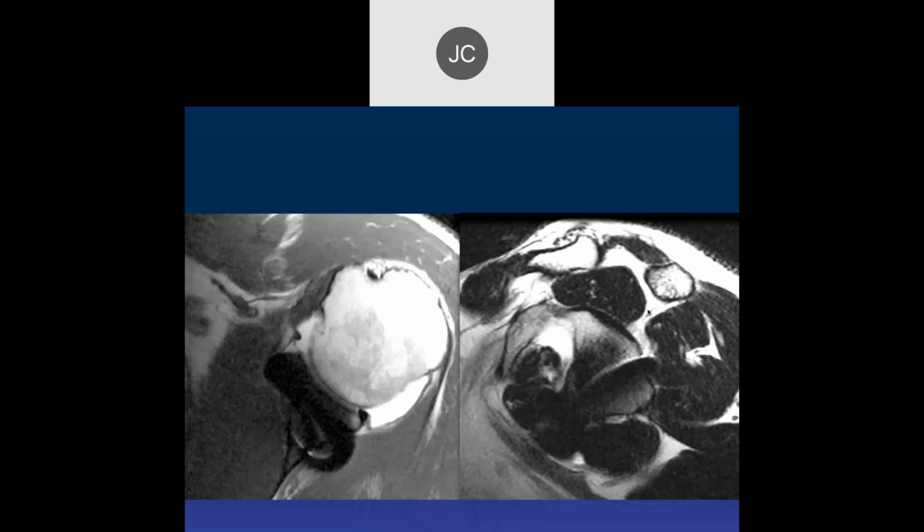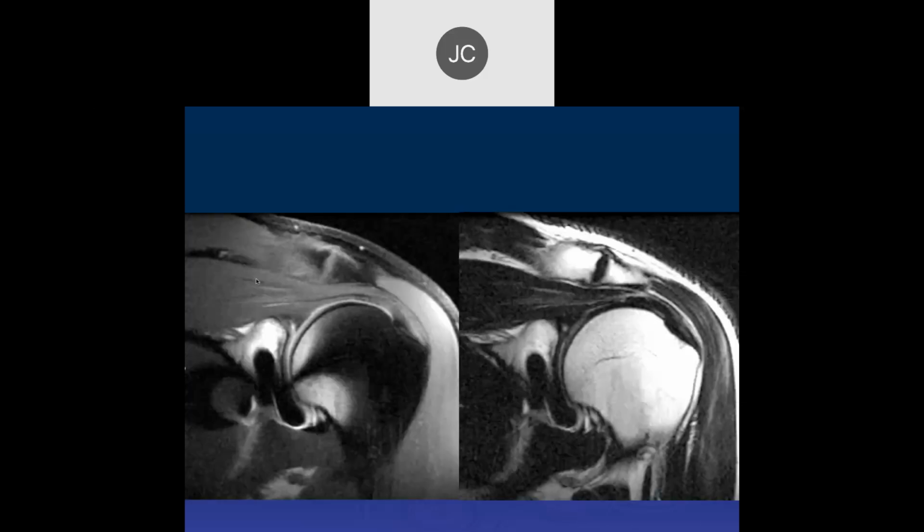Okay, so we got the artifactual signal in the glenoid. It looks like there's a lot of metal there, and it's right on the anterior, centered around the anterior glenoid. So what do you think this is due to? A repair of that labrum, but I'm not sure.